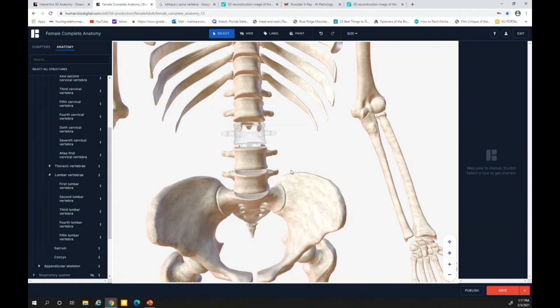So we should see the left, which is the one we were just looking at with the patient rotated in RAO. But now it's going to look anatomical position. This one's going to look anatomical because that's the way we're taking it. In the RAO, it didn't look anatomical because we hadn't flipped the patient; they were in position as if we were standing in the room taking the x-ray of them at that moment. So it wasn't like we were looking at the x-ray in the RAO. This one's going to look just like the x-ray looks.